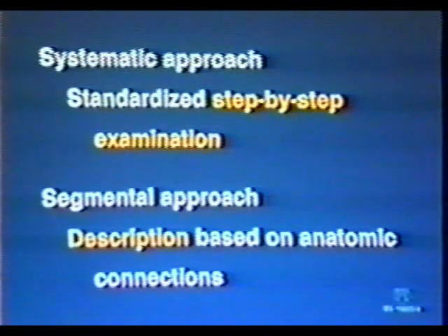For evaluation of cyanotic and complex congenital heart defects, a systematic as well as segmental approach is required. Every examination should be performed in a methodical manner with complete understanding of transducer and image orientation. We recommend that 4-chamber views should be oriented with apex down, which displays the image in a familiar anatomic format.